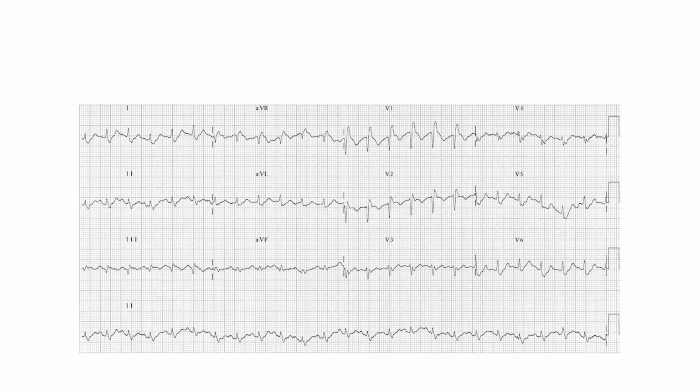Looking at the Brugada one a second time, it looks a bit right, right? Maybe hemi right, maybe full right. It's almost an RSR, right? So it's probably just a right bundle with negative T waves in both here and here.